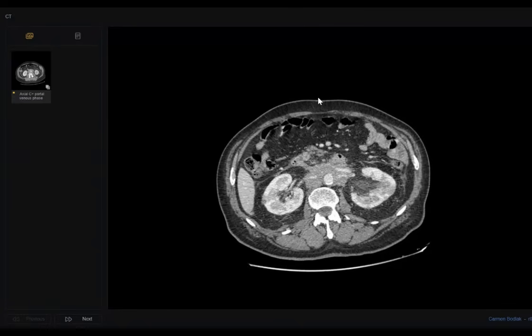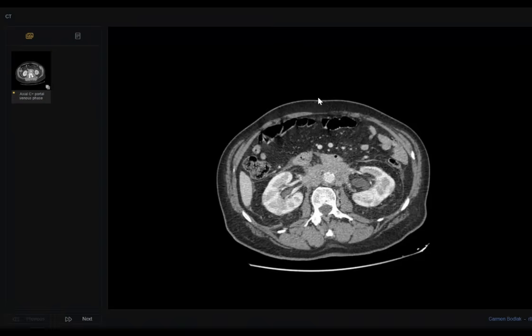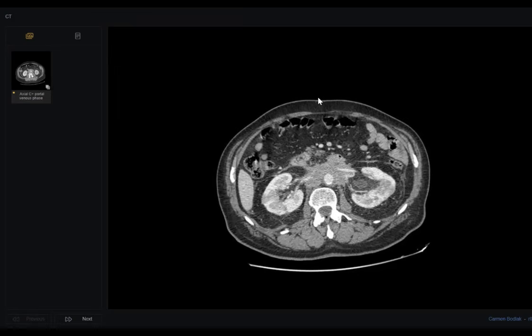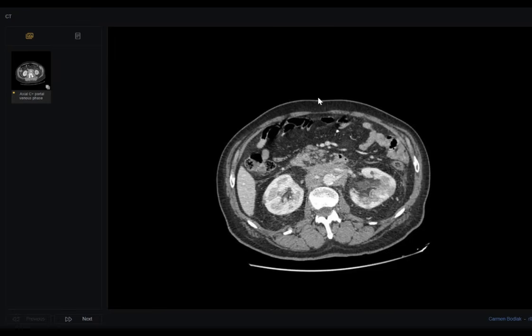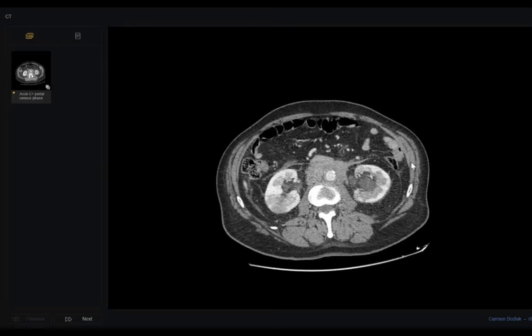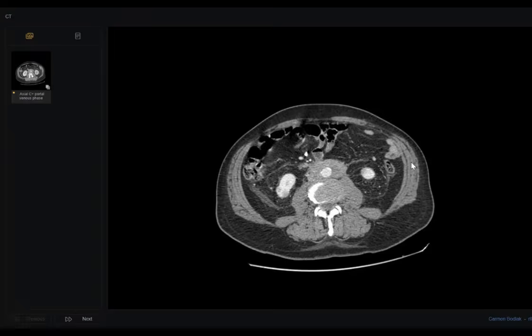Can you take from this one? I don't know actually. I think after the end of both kidneys, the technician should lower down, and this is very suitable. What's your answer? No, I think this is the origin of the renal hilum, so I should go down below the kidneys to avoid the renal vessels and bowel injury. I have to go down, after the kidneys finish.